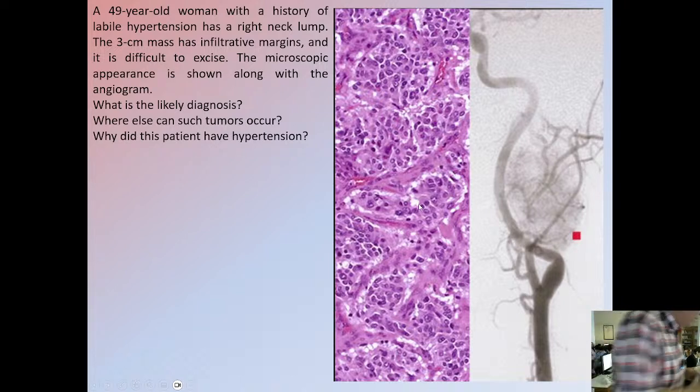Is there a considerable degree of nuclear pleomorphism, or do the cells more or less look like each other? For example, when you examine a neoplastic population, if you have evidence of pleomorphism, different sizes of nuclei, different shapes of nuclei, you can hypothesize that it is a malignant neoplasm.